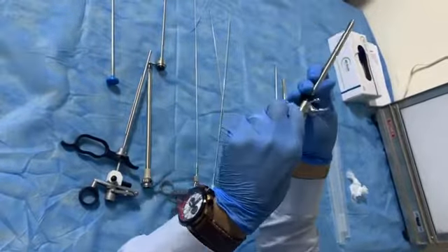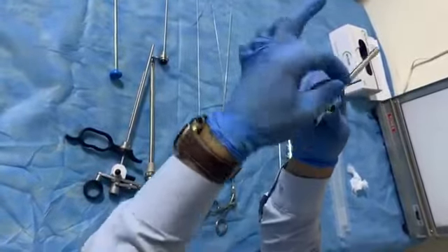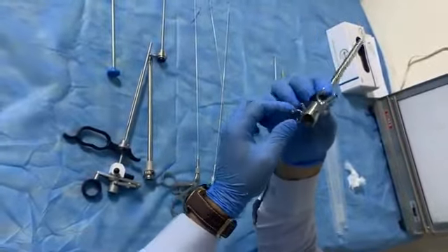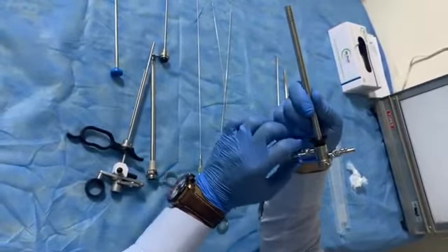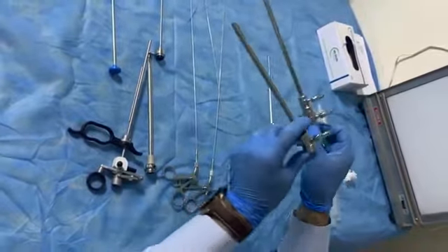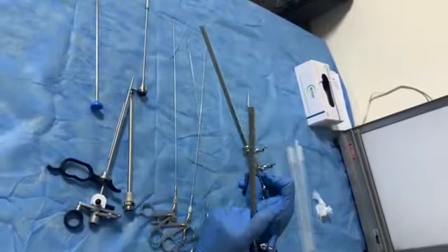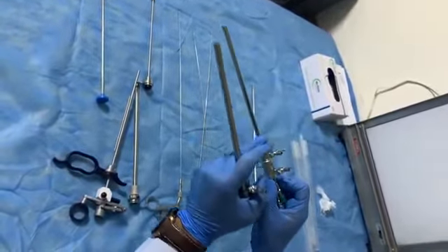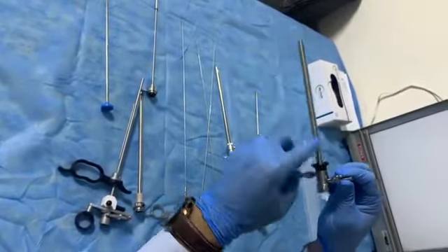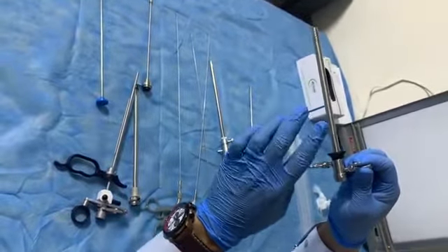For exit of fluid. And don't forget, this source near to me for input and far away from me for output. Sometimes both of them are at the same level, like this. But don't forget, beside me it is for input, far away from me for output. This one, beside me for input, it is up. Far away from me, it is down for output.